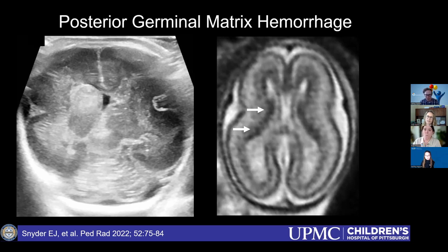It doesn't feel quite right to call that a grade 3. So I personally tend to grade it on the initial ones and then be more descriptive on the follow-up, because some of the nuance is lost with those follow-ups as things evolve with the hydrocephalus.